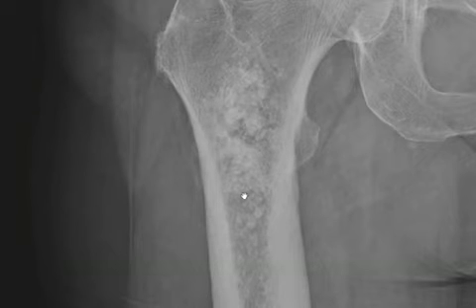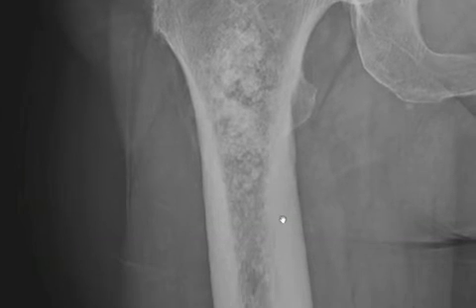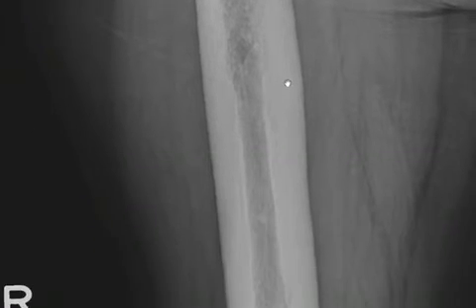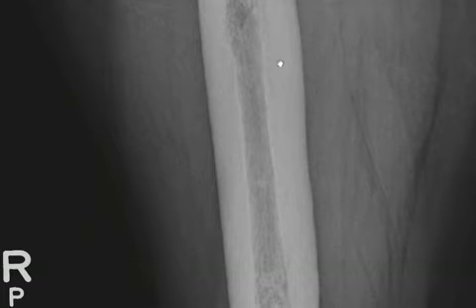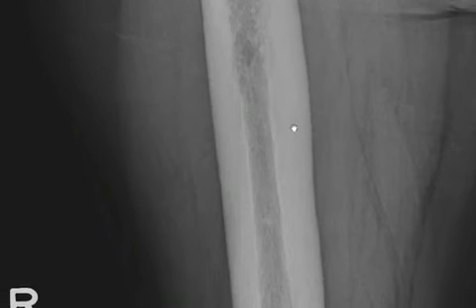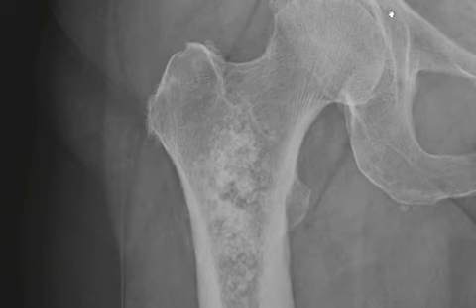sclerotic radiodensities, so this tumor is forming some matrix. It's located centrally within the bone as opposed to being eccentric, and then as we look down along the shaft, there's further radiodensity, extensive cortical thickening, and a small amount of scalloping of the endosteal surface. When bone gets thick like this, it's typically an appearance of chronic, long-standing process, but doesn't mean it can't be a long-standing, slow-growing tumor. Elsewhere, the rest of the bones in the regional skeleton look unremarkable.